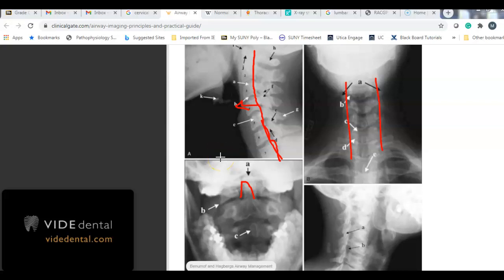If you're going into a cervical x-ray review or thoracic, and you don't remember, pull up normal anatomy first. Look at a normal anatomy x-ray review. There's a million of them out there. I know because I've just been pulling up examples to show you. And you can grab that normal anatomy first before you go in.